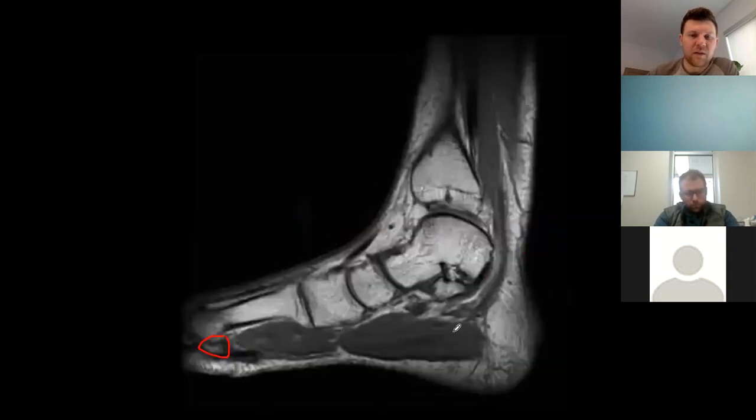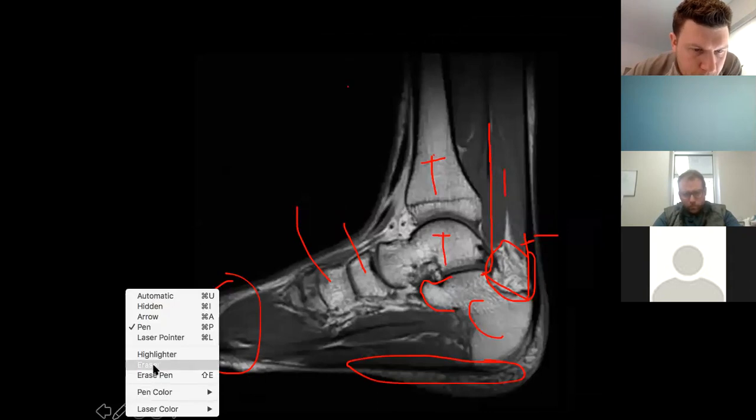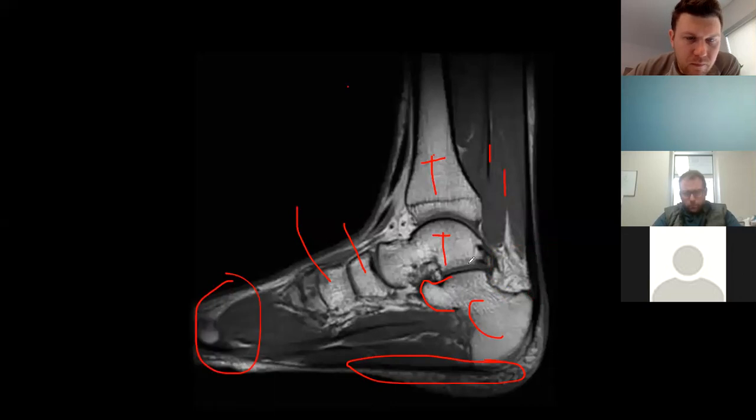Who wants to take on this one? Can you see it on, let's see, Clarity said, let me clear this out. So what small accessory bone? Good. We've got some people in the chat room. Okay, everyone's got it. Os trigonum back here.